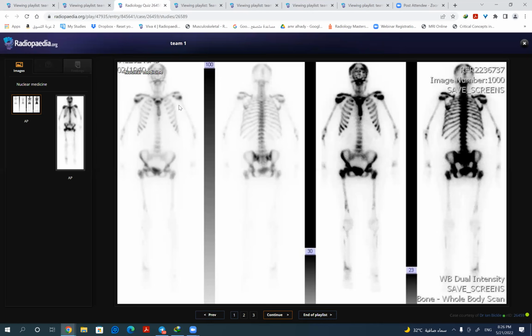So my conclusion for this pattern is basically a super scan that is consistent with bony metastatic disease, which in a female is breast CA, or in a male patient is likely to be prostatic CA. So in my routine practice I would correlate with the clinical history and presentation and see if the patient is a known CA, then we need to correlate with any previous imaging.